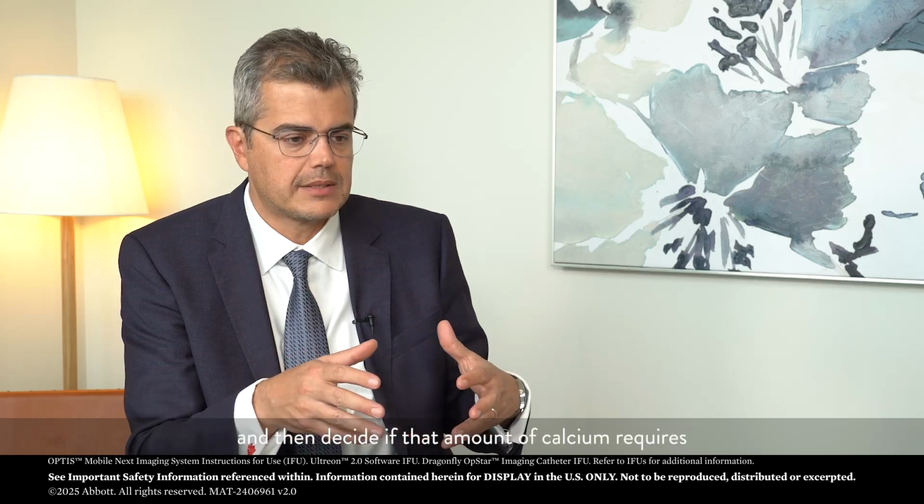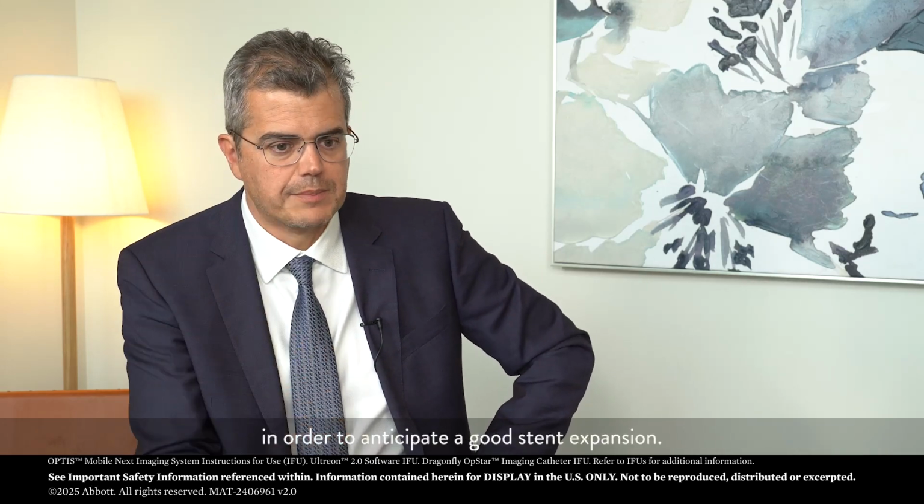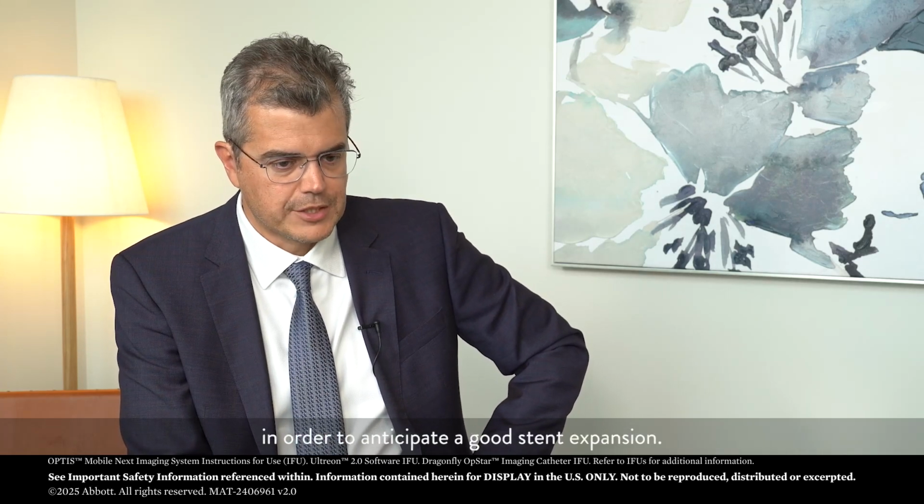So you can use that information. You can qualitatively assess the milieu in terms of calcium distribution, and then decide if that amount of calcium requires any sort of lesion preparation in order to anticipate a good stent expansion.